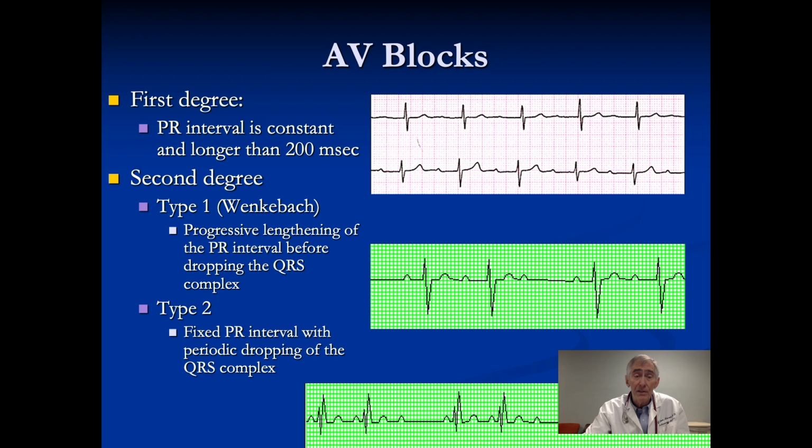This means that the RR interval here is an exact multiple of the two PP intervals, or it could be 3 PP intervals. This indicates conduction system disease that is highly significant. And notice how the QRS is a little wide, which also indicates conduction system disease.